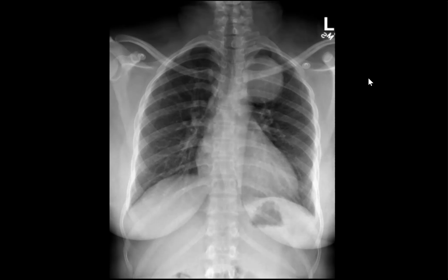My differential diagnosis includes abscess or osteomyelitis with abscess formation, or hematoma, or extramedullary hematopoiesis, but I don't see any bony changes. There is no expansion or prominent trabeculae. It also includes neurogenic tumors, including schwannoma or neurofibroma. So I will convey my findings to the referring physician and recommend further cross-sectional imaging, CT or MRI.